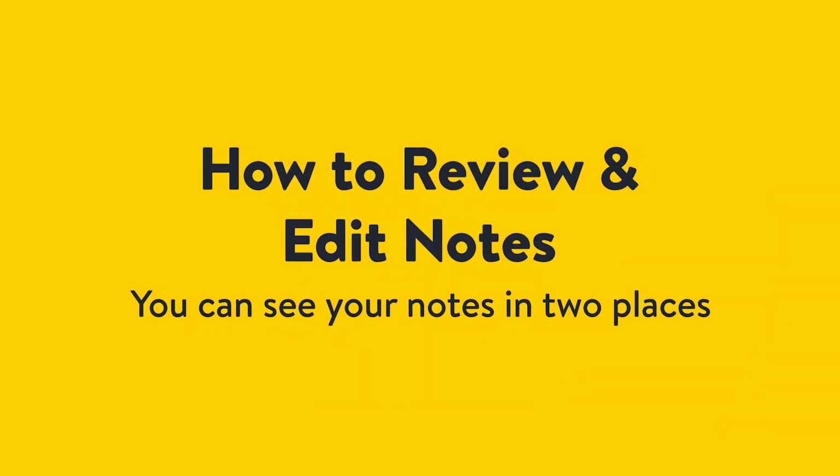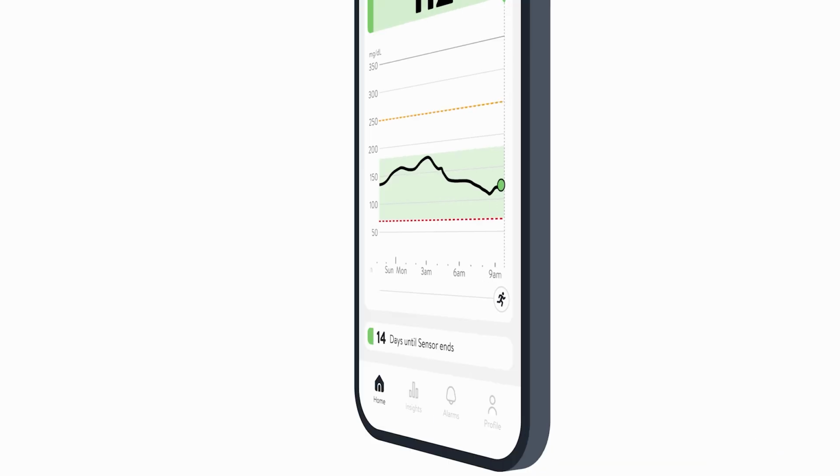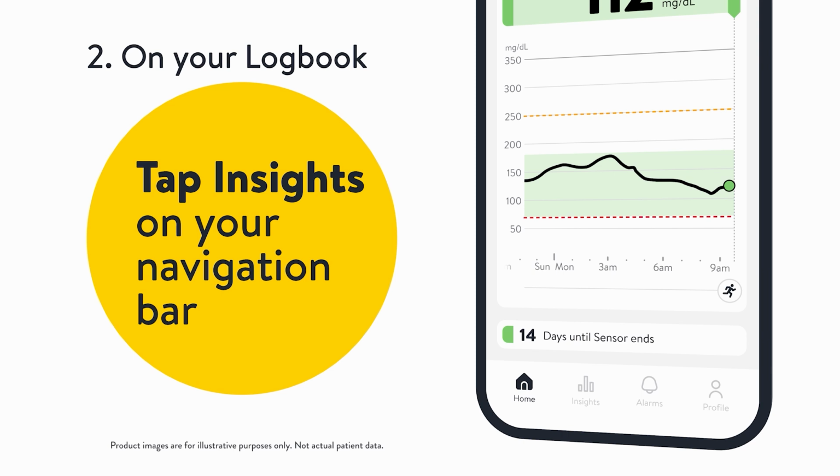You can see your notes in two places to review and edit them. One way to see your notes is on your home screen. Tap on the note icon to review or edit it. The other way to see your notes is on your logbook.